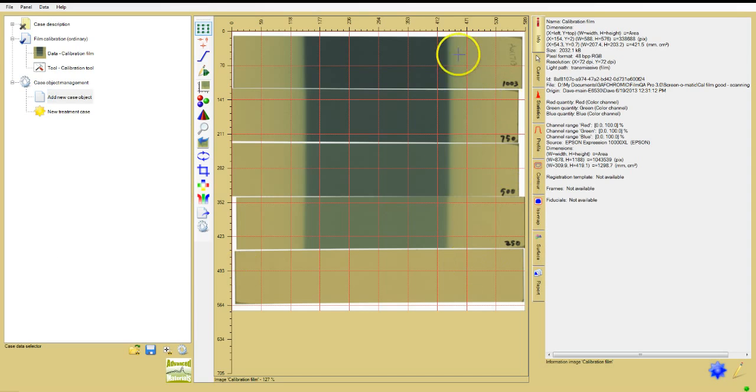The technique of having all the calibration films in a single scan is called one-scan calibration. It not only minimizes the number of calibration images, but also uses your film and time efficiently. Because Film QA Pro uses asymptotic fitting functions that behave like film, that is, the responses approach constant values at high dose, just as the darkening of film gets progressively smaller with each dose increment, so fewer dose points are needed to correlate the specific response of a film to dose. As few as 3 points could be used, but we add 1 or 2 for redundancy.